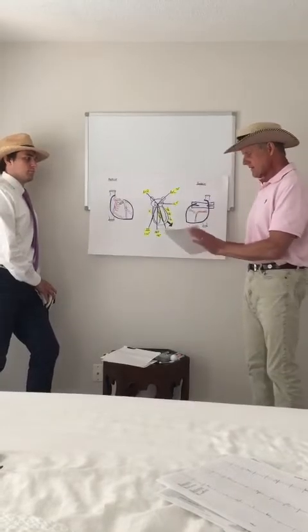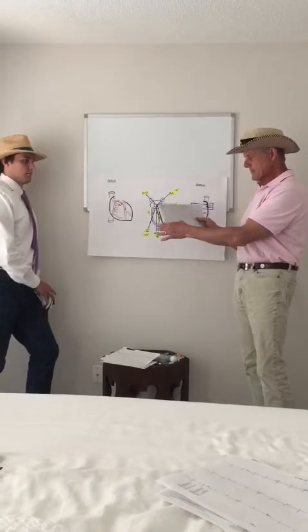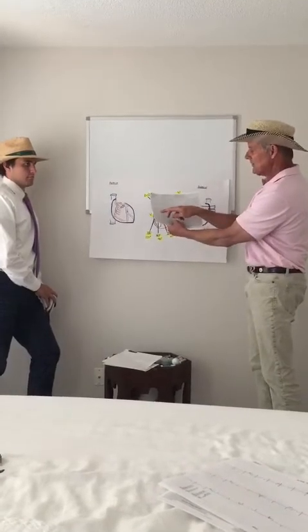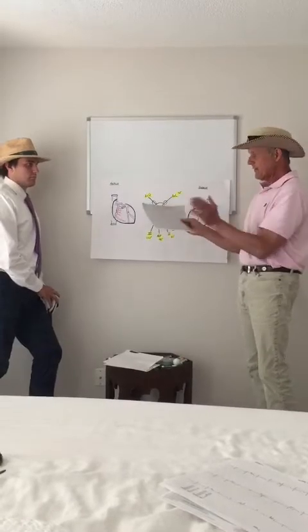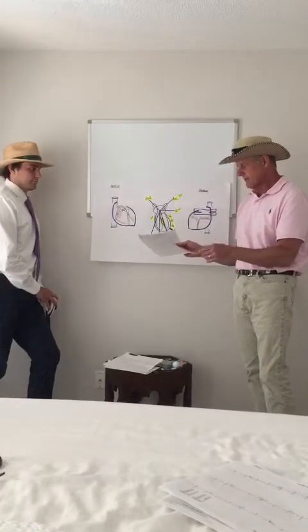So, in this particular patient who's having a heart attack, it's an acute inferior infarct. You have massive ST segment elevation in leads 2, 3, and AVF. That's unequivocal. And then you start scanning, and you think your job's done. It's not. You have to look at the last half of the EKG. You want to look at the whole EKG. You don't want to get tunnel vision.